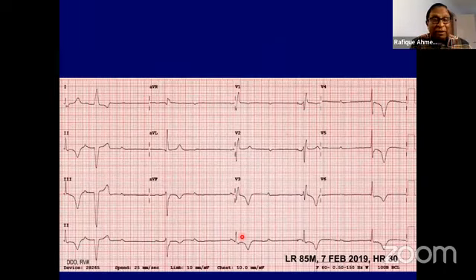Look at this. This is a patient with a dual chamber pacemaker who comes with syncope. There is a P wave, but there is nothing after that. And there is atrial pacing also. This pacemaker basically is not delivering any spike after the P wave. That means this was a patient with RV lead fracture. If there is a fractured lead, you will not see any signal at all. And it was programmed appropriately.